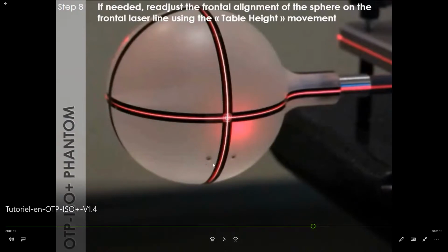We will remain on this view as there are several interesting things to look at here. The tungsten ball inside the sphere is aligned on the equatorial engravings. You can now say that the lasers are aligned on the tungsten ball, and the tungsten ball, which will be visible in the images, represents the intersection of the laser planes in the treatment room. All this for the Winston Lutz test.